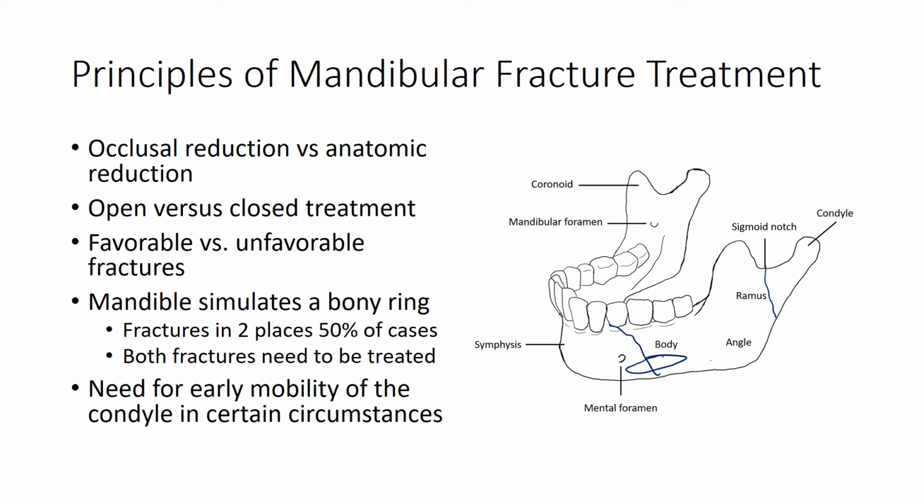And the reason is that if you don't put a plate here, the way to treat this fracture would be 6 weeks of fixation, but that would be a bad way to treat this fracture. So they'll put a plate on this fracture right here, and that will allow for, let's say, two weeks of fixation, and then they can slowly take the patient out of fixation and allow them to mobilize the joint and prevent ankylosis or limited mobility later on. I'll show an example of this and hopefully it'll make more sense.